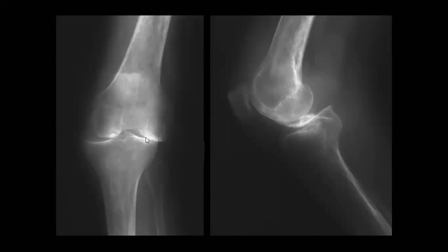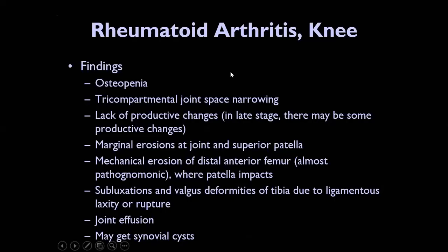But when you find the lateral joint space narrowed in the knee, think about other things that could cause this, and one of the most important is rheumatoid, right? Yes, perfect. So don't forget, when you find erosion, don't rush and mention just osteoarthritis. No, you are going now with another differential.